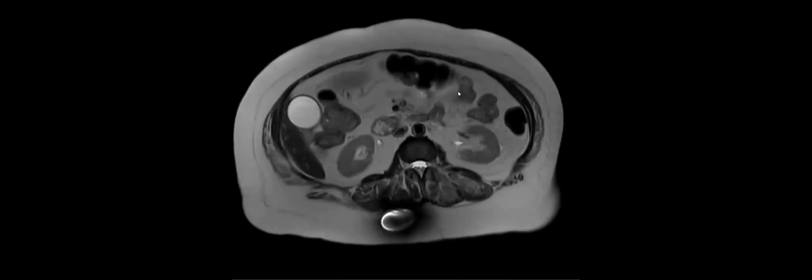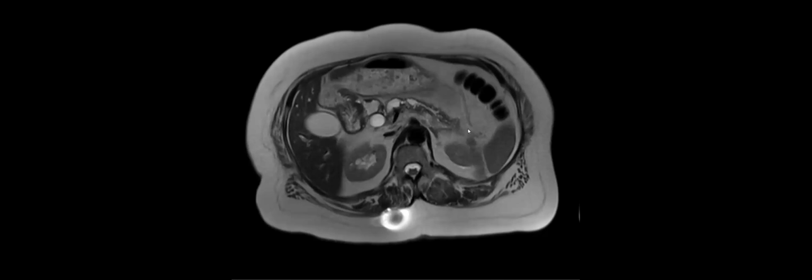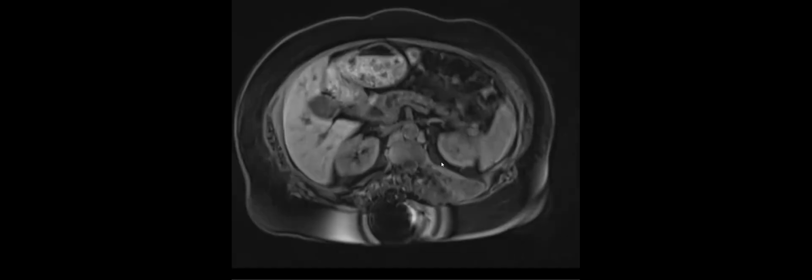Now we see the double duct really nicely. And again, there's the lesion. You can actually see the flow void of the SMV being pulled and narrowed here by this cuffing of the soft tissue. And I'll show you some other phases. Here's our pre-contrast. The atrophic gland is pretty dark, but then here's the lesion. And arterial phase, really nice. So double duct, and then this hypoenhancing mass standing out right there. And then here's the diffusion.